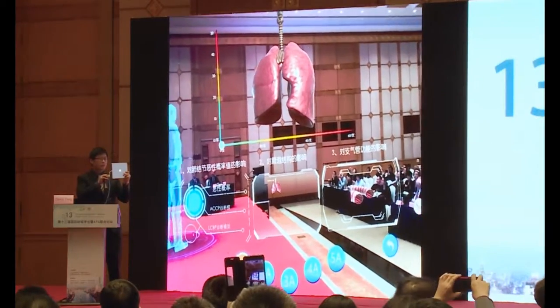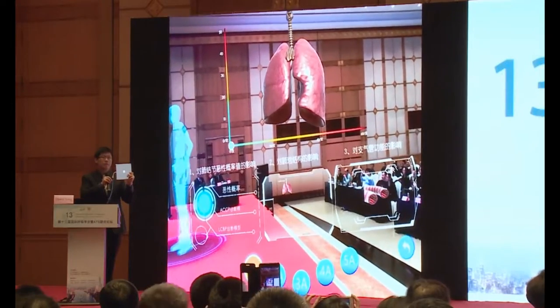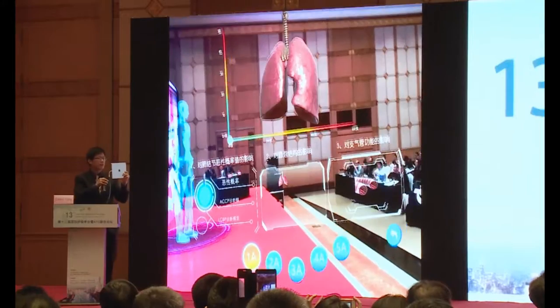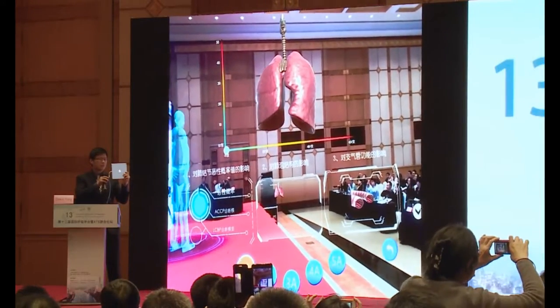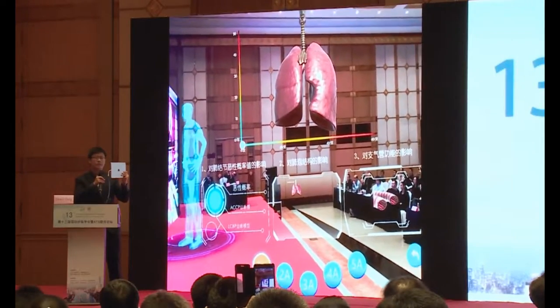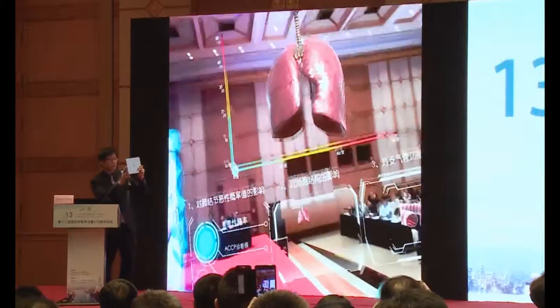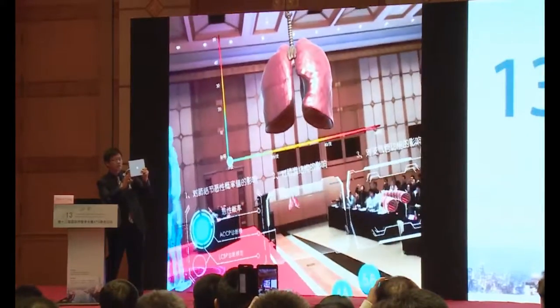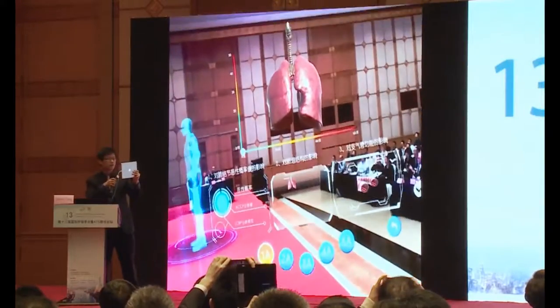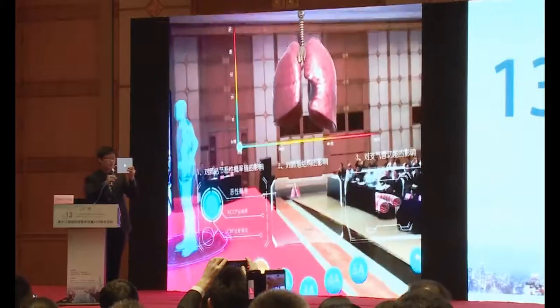Actually, this is a real lung, so we can easily use 3D reconstruction technology from the patient's CAT scan. It's very thin now, so we can have a mimic one, and that's just breathing there. If you download the apps, you can even hear the breath sound of the patient. And actually, that sound we can go close to. So I'm sorry, I'm just standing by the lines, but you can actually go very close, even into the bronchus. So maybe later I will show you these exciting effects.